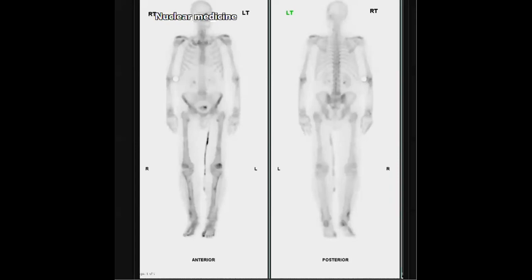So, is it bilateral or unilateral? Is it symmetrical or asymmetrical? The distribution here is very important before you jump to the diagnosis. So you will be telling the examiner that the distribution is patchy, peripheral uptake, taking the tibia, yes, rather symmetrical, exactly, perfect.